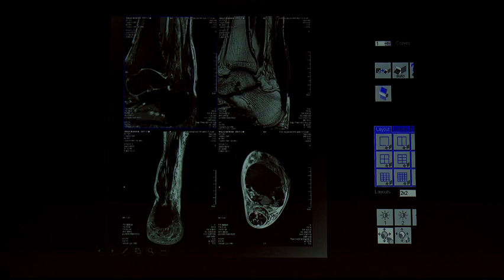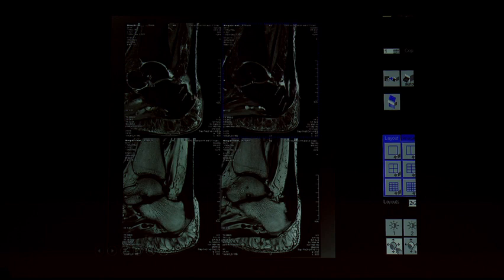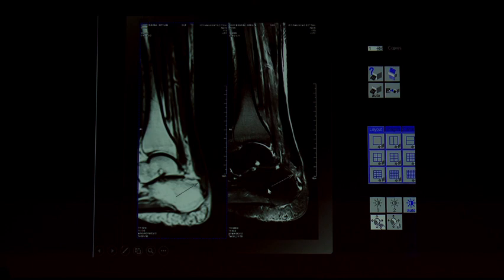You can see that it has become rounded or ovoid shaped with the intrasubstance bright signals, and classical footprint avulsion. You can see the footprint or insertional site avulsion injury with marrow changes. This is one among the part and parcel of Haglund lesion. That means footprint tendinosis, tear, proliferation of the postero-superior calcaneum, retrocalcaneal bursitis, and retroachilles bursitis. This is very classical appearance of Haglund lesion.